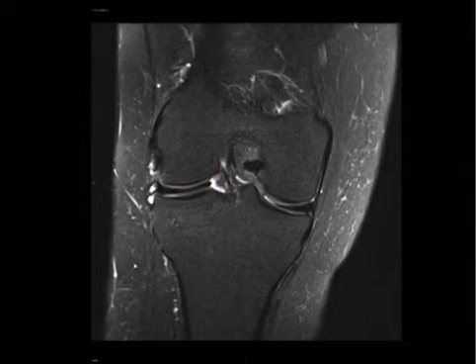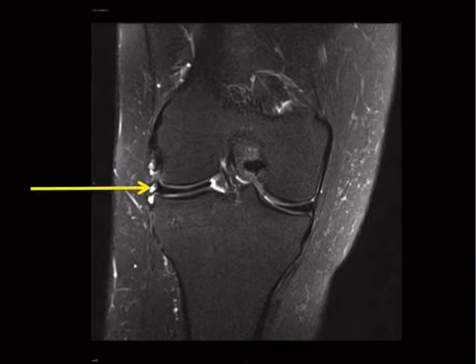All right, next case. So, coronal knee gamesmanship. If I show you a coronal knee and there's not a bunch of edema in the bone, this is the thing you should be looking at right here. So this is a discoid meniscus. Notice it's going all the way across. It shouldn't do that. So normally meniscus are horseshoe shaped or C-shaped. This one is shaped like a disc.